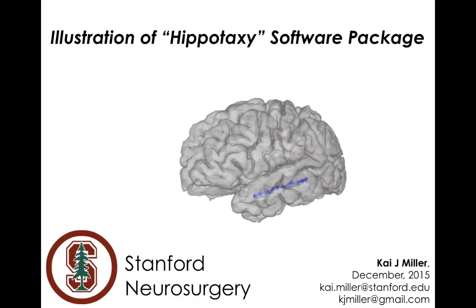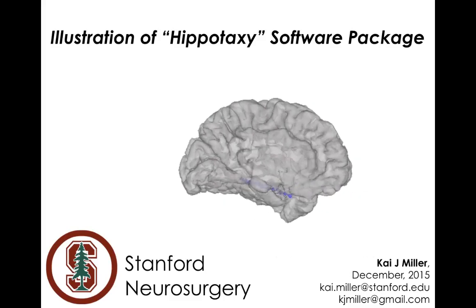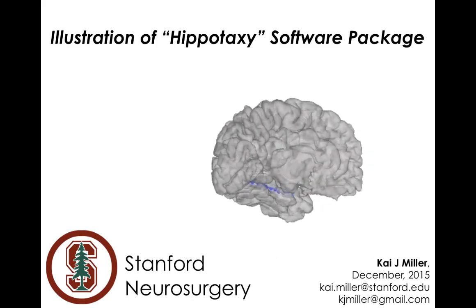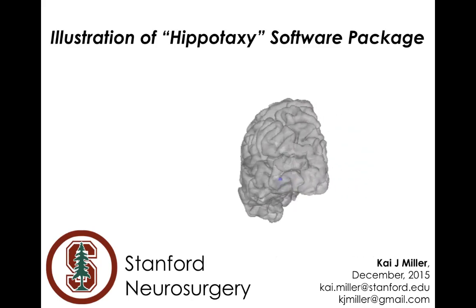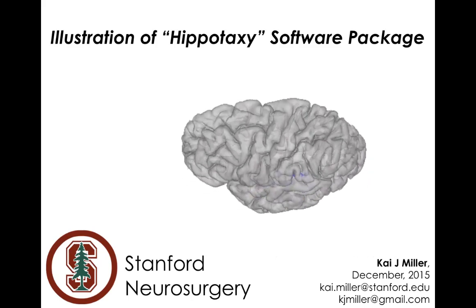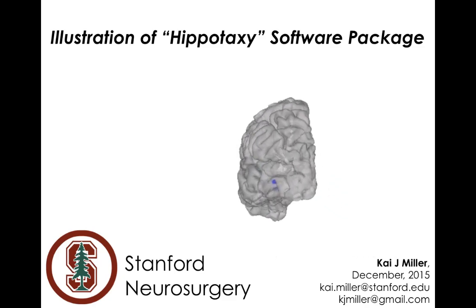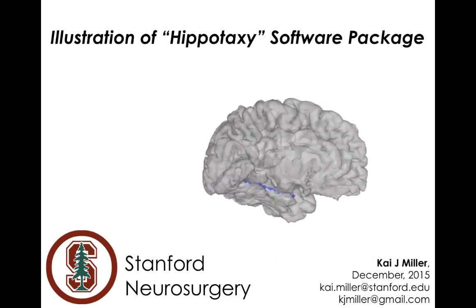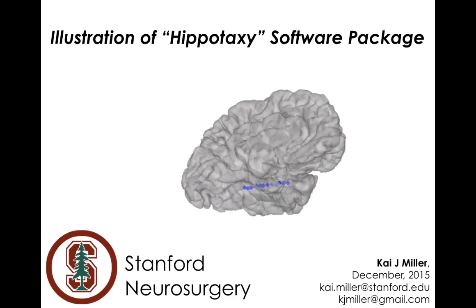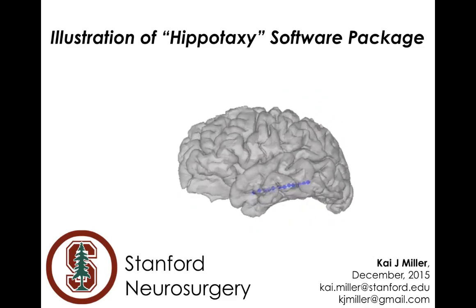This video is meant to be an illustration of how to use the Hippotaxy software package for targeting mesial temporal lobe structures as well as the amygdala. I'd recommend using the manual that comes along with the program as well, and after watching this video, going through step by step, making sure each step is done in the same way as the manual.